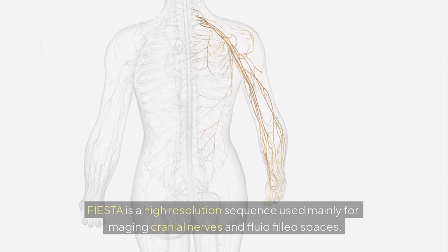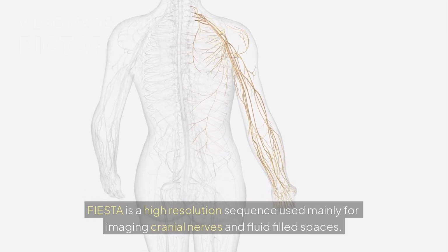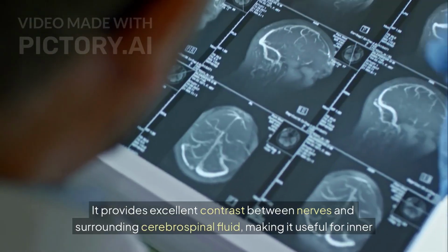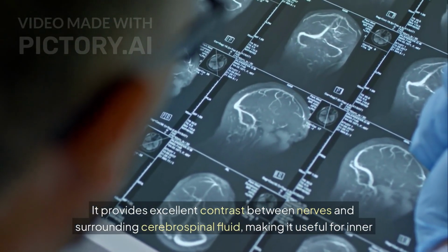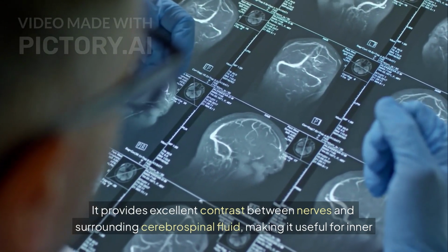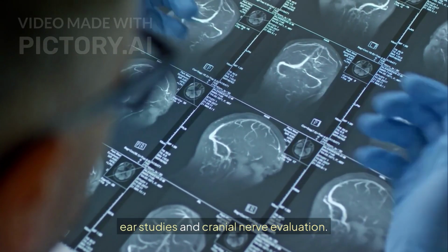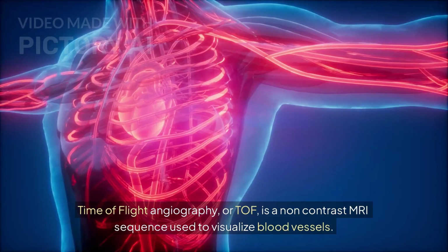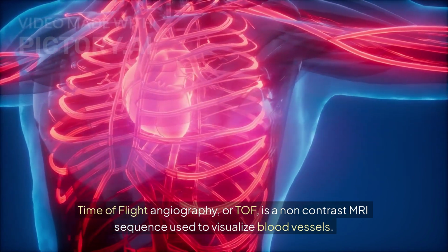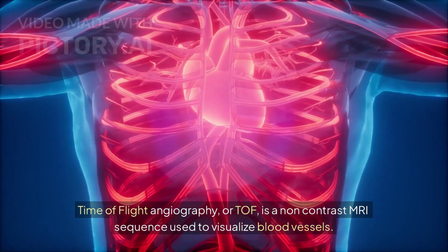FIESTA is a high-resolution sequence used mainly for imaging cranial nerves and fluid-filled spaces. It provides excellent contrast between nerves and surrounding cerebrospinal fluid, making it useful for inner ear studies and cranial nerve evaluation.